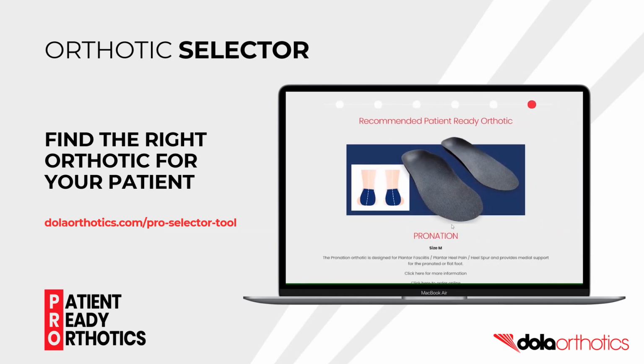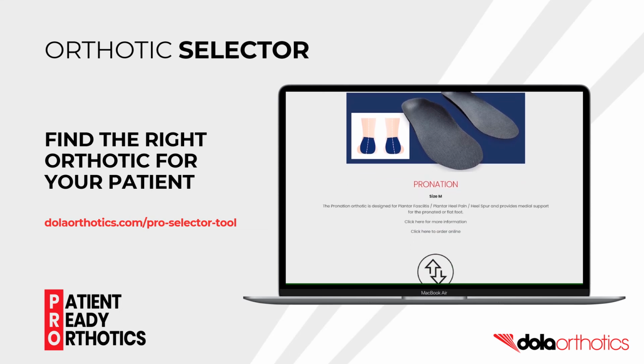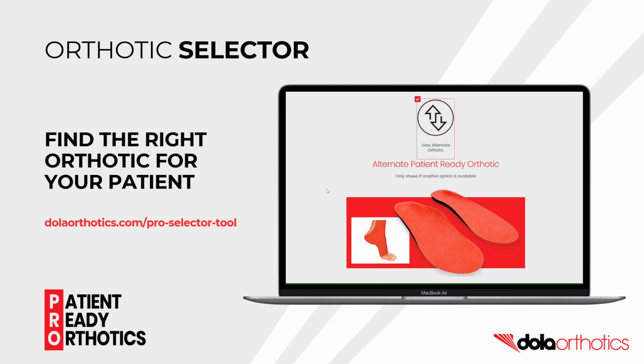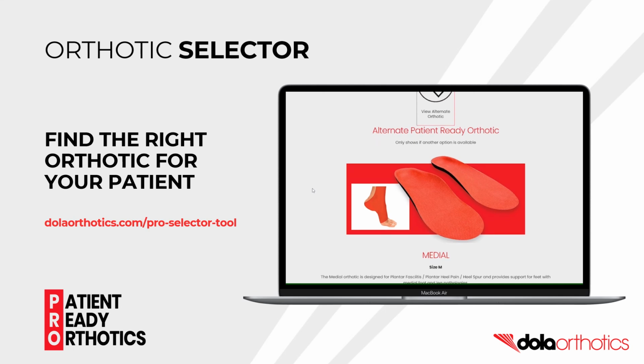You will now be provided with the recommended patient-ready orthotic style based on the information provided on your patient. In this case, the pronation patient-ready orthotic in a size medium. You can also select an alternative option, which will give you another suitable option based on the patient information. In this case, the medial patient-ready orthotic was the alternative orthotic recommended.